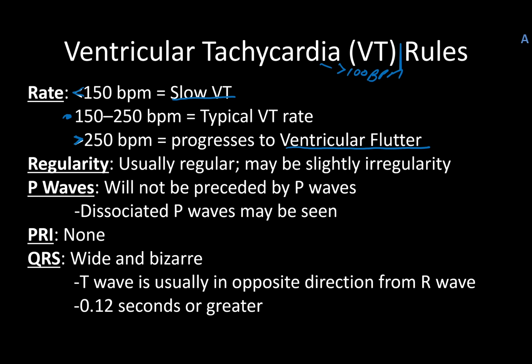So your regularity, nothing different there. You really won't see P waves. If somehow you manage to see them, it's because there's AV dissociation going on, and the QRS that's being produced during the V-Tach is just not being communicated.